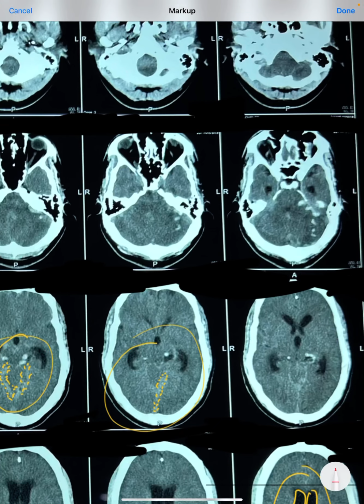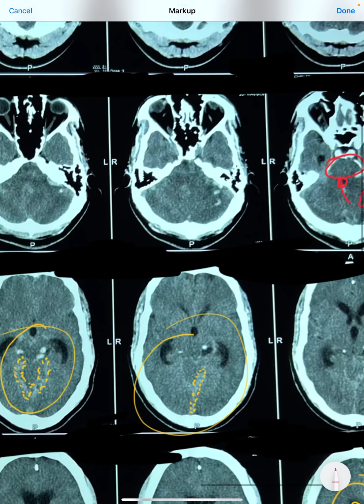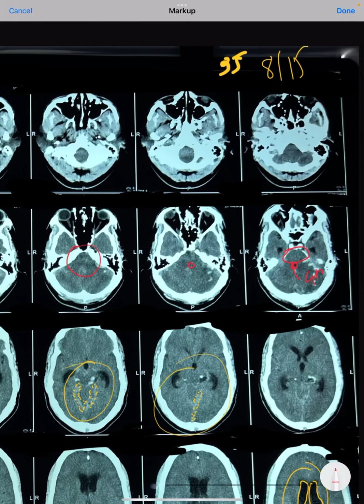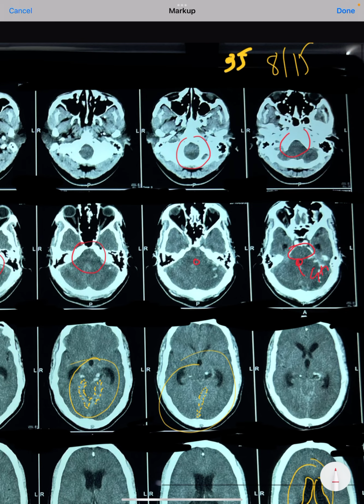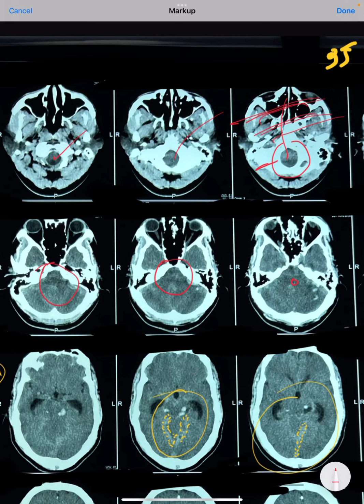This is the pons, the pontine part, which we can see because it is almost perfectly circular, and behind that we can see the fourth ventricle. But here we are not able to see that fourth ventricle. It is very small, very constricted here. The fourth ventricle is not apparent. And this is all medulla, because this is the exit from the brain; we can see the brain has all ended and now the spinal cord will start. So this is the medulla, and in the medulla we are not able to see that fourth ventricle.